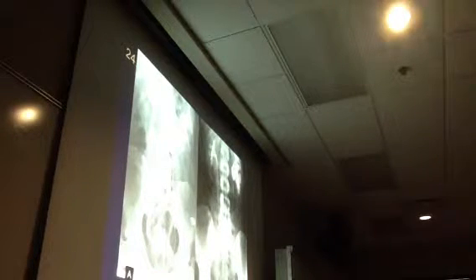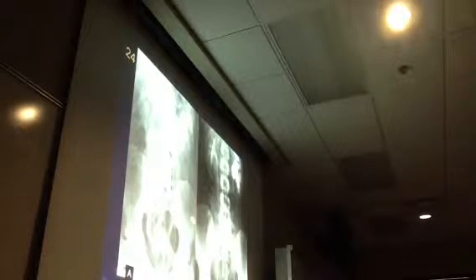Can you see the catheter here? And then this is contrast in the ureters. And actually, this is another catheter, isn't it? And so there's contrast in the pelvic system, in the renal system, in the pelvis and the calyces. And there's contrast over here in this ureter and the catheter here. So this is a pyelogram.